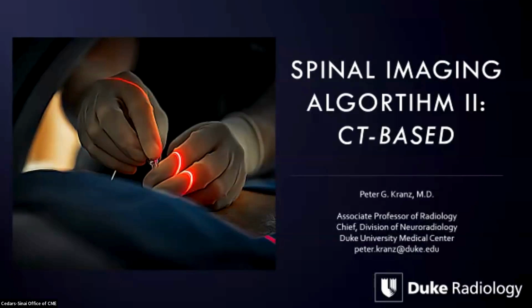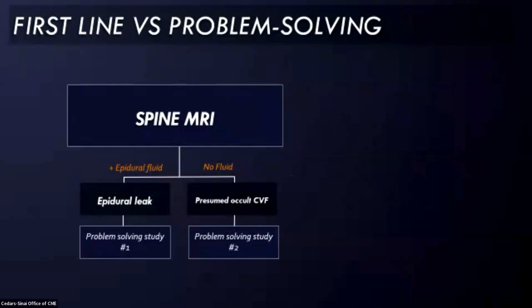So I'm going to show you some of the things that I like CT-based evaluation for. And if you happen to have CT available to you at your institution, and this is the way you use them, hopefully you'll find this useful.